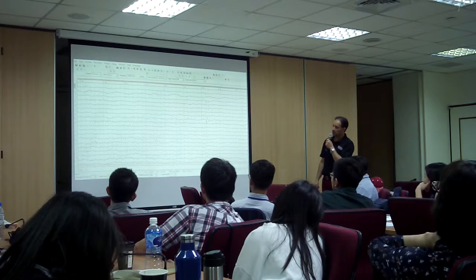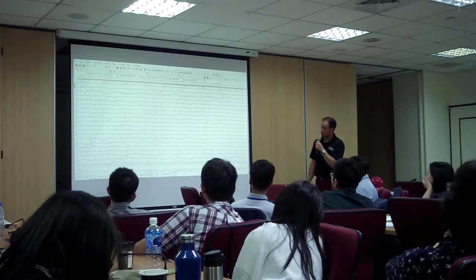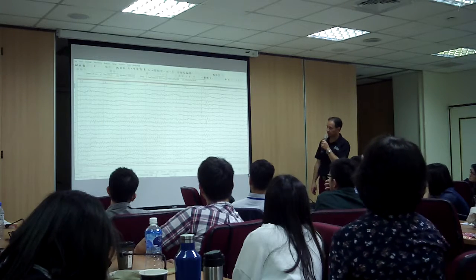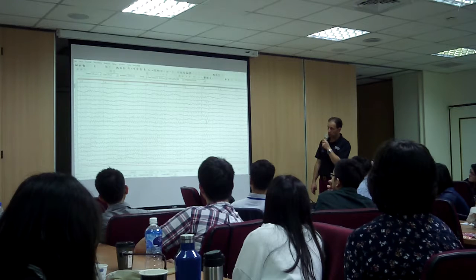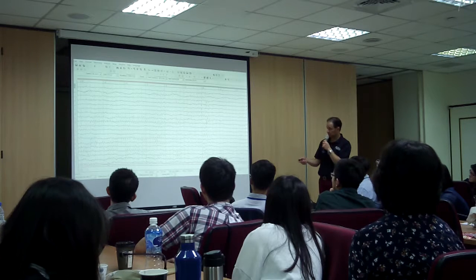So, the first thing that we look at is what? The amplitude of the brainwaves. So what do you see there? What kind of amplitude do you see? Is it slow or fast brainwaves? So we have some slow brainwaves. Good.